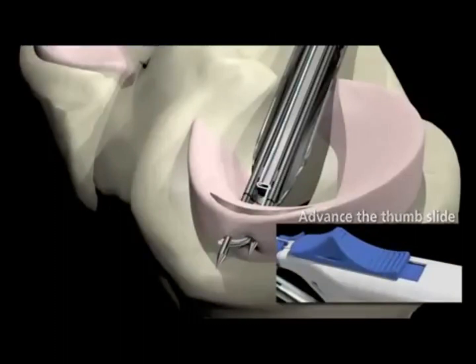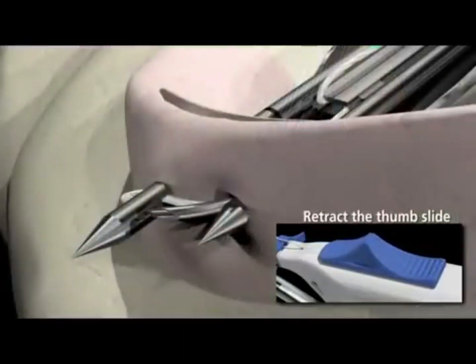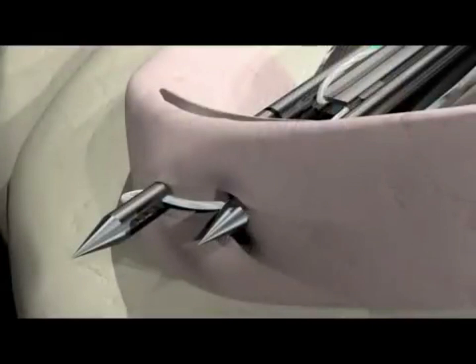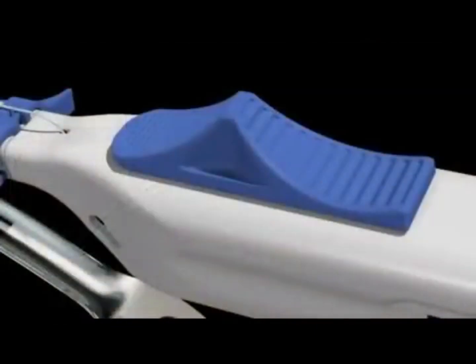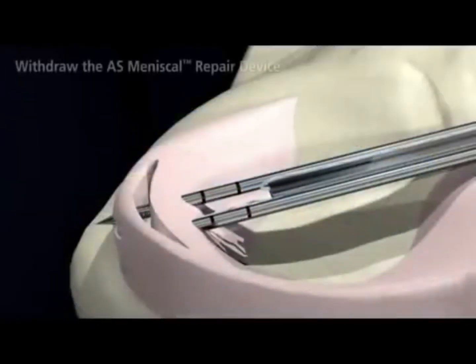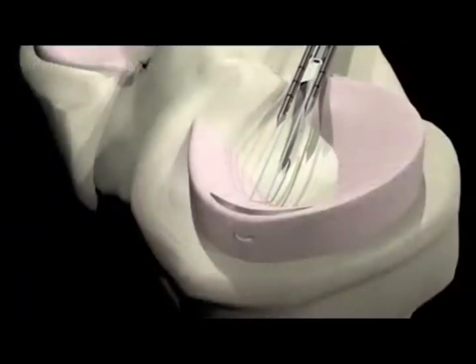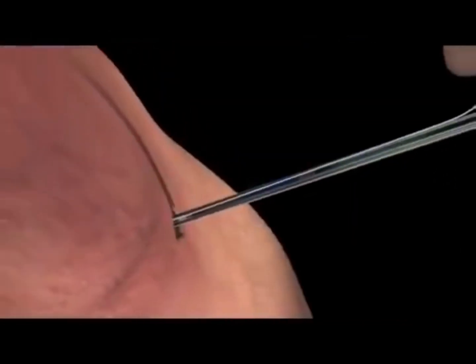After the thumb slide is advanced forward maximally, it can be fully retracted. This will retract the passing wire and capture the suture in the long needle as it is passed from the short needle. Note, at this point, the thumb slide should be locked out, not able to advance forward. To check, make sure you are unable to advance the thumb slide again. Withdraw the device. Maintain the thumb slide in the full back position. The suture will deploy from the device, passing the suture across the tear.